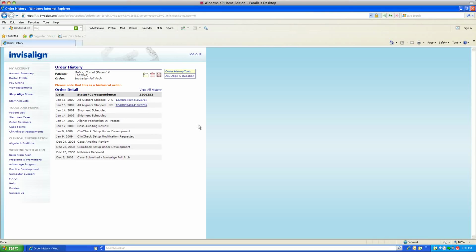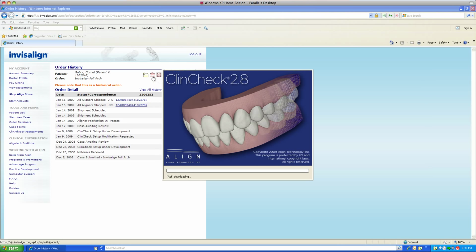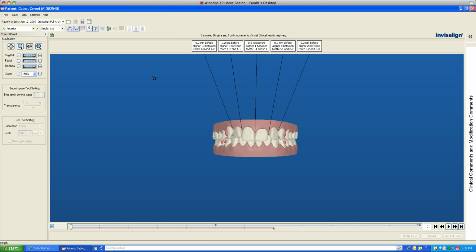This video will be looking at the Clincheck software. So in the order history, click on the Clincheck icon, which will load up the software. In our case, we're using Clincheck 2.8, which at the time of this video is the latest version. So what loads up now is the Clincheck software.